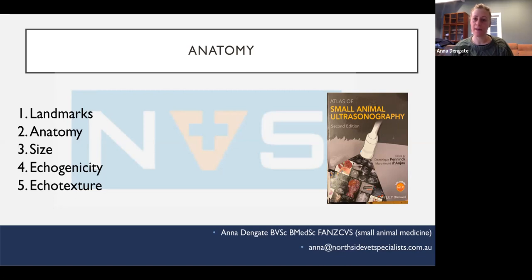The one thing I'll say about them is that you can have quite focal causes of hepatomegaly. So one lobe might be enlarged. So check the right and left liver, the points of the liver lobes. If they come to a nice taper, probably not enlarged. If one is rounded but the other comes to a taper, you've probably got focal hepatomegaly. And if they're all rounded, then you've probably got diffuse hepatomegaly.